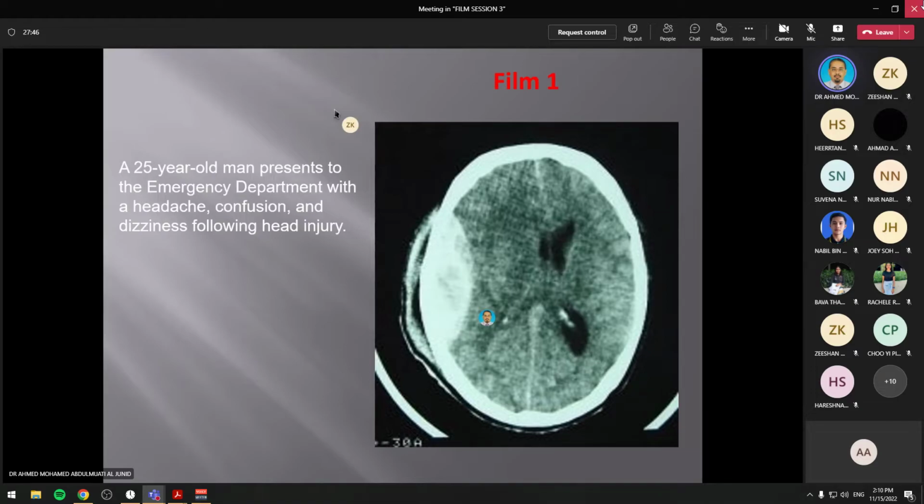Okay, if I am at the level of the Sylvian fissure, I have to check. If I can see it on the normal side, but I don't see it here, then I say effacement of the cortical sulci. If I am at the level of the basal cisterns, then I check whether they are effaced or not. So under positive mass effect, you have to look for these points.